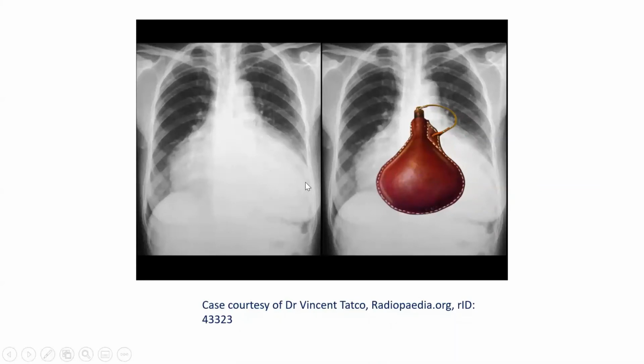The heart now is too big, with a flask shape or water bottle shape. This is water bottle shaped heart. Water bottle shaped heart is what? Pericardial effusion. Yes, exactly.